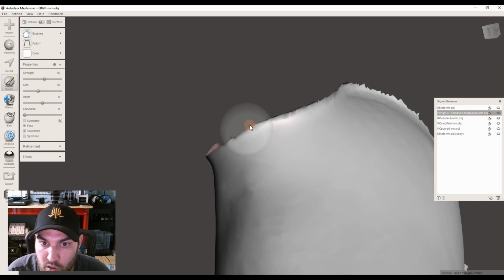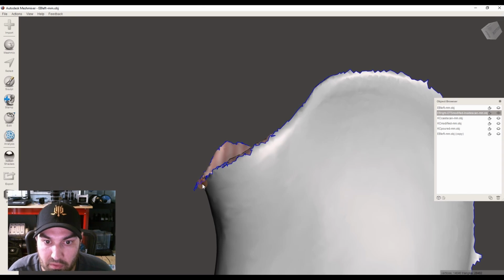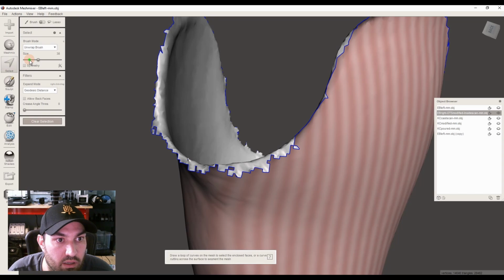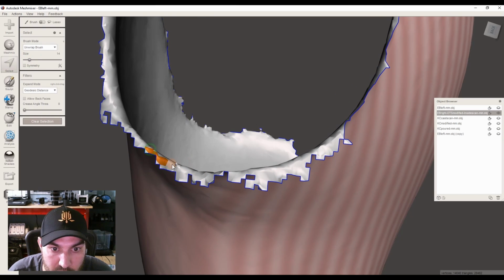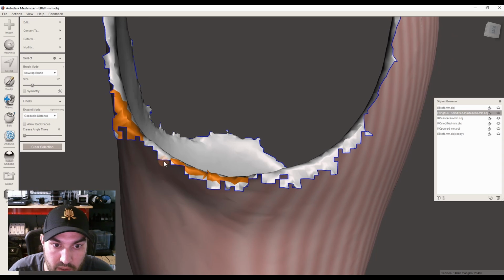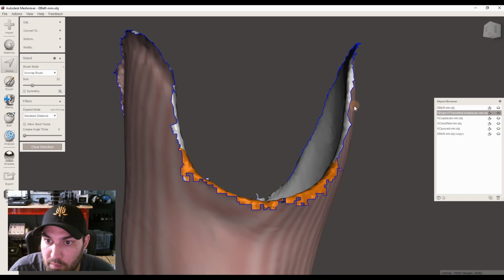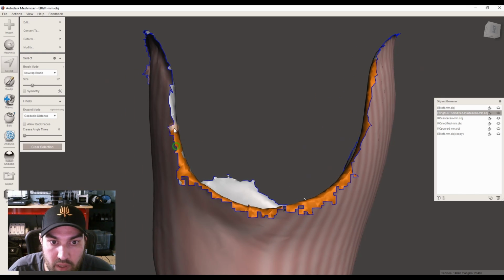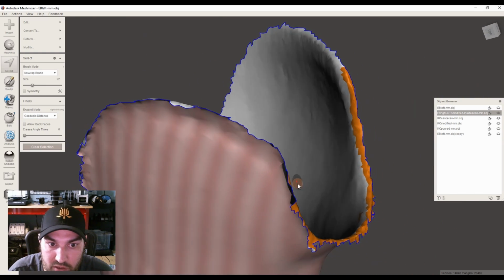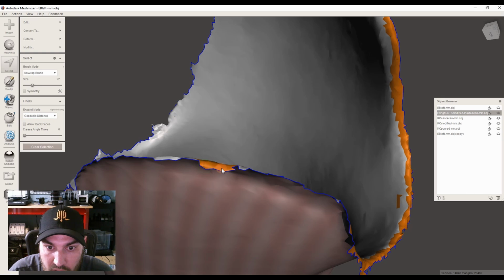So some of this is overhanging too much. So what we would have actually wanted to do there is come in here and clean this up even further before we go to the next step. And that'll just make your life easier when you're cleaning up those edges. So I try to do anything that is past vertical on my inner surface, I try to get rid of.